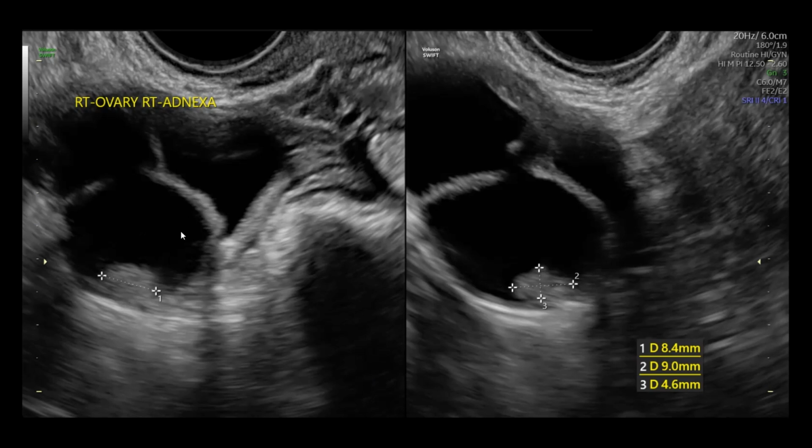But it's also just really important to understand the mechanism. As the sound waves are traveling through tissue, certain tissues allow sound to travel more or less. And typically, cancer type tissue is going to allow the sound to travel more through that tissue.